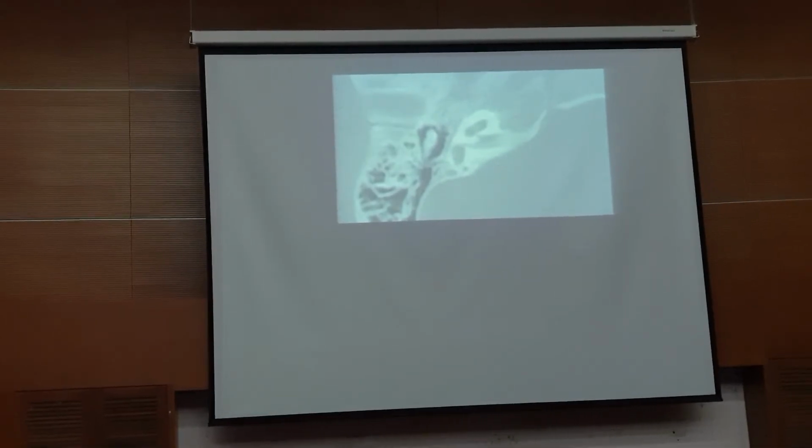Alright, so this patient had a very stenotic cochlear aperture. And you notice also this is the vestibule, and there don't seem to be any canals around it. So the semicircular canals are aplastic or dysplastic. Okay? When you see semicircular canal aplasia or dysplasia, like this, like just the vestibule there, patients often will have sensory hearing loss, they often have cochlear nerve hypoplasias. There's a syndrome you should think of. I'm sure there's other clinical stuff that I'm not aware of, but this is classic of anybody?